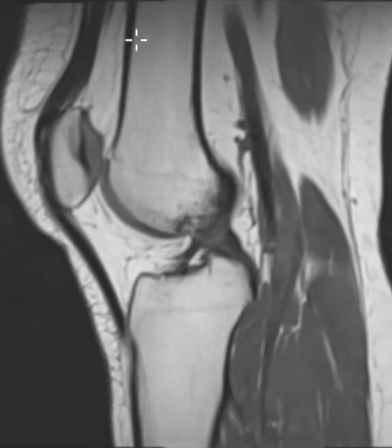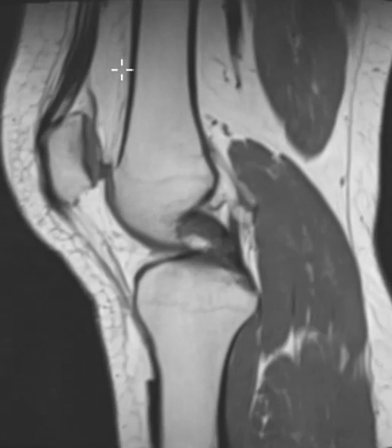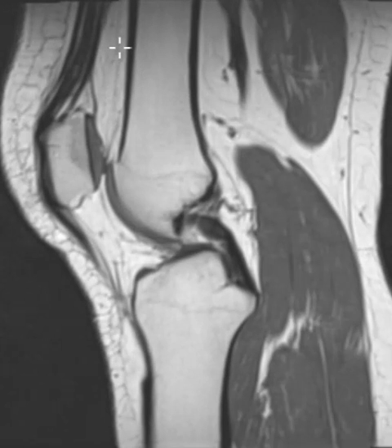And in the very front of the femur, there's the prefemoral fat pad here, this vertical band. Almost never see anything wrong with the prefemoral fat pad, so you can almost just disregard it. But there's a little triangle right here called the quadriceps fat pad. The quadriceps tendon comes down here, attaches on top, and this is a little fatty triangle. Usually it's about the same signal as the surrounding fat, but you can see it right here. And sometimes it can get inflamed and swollen.